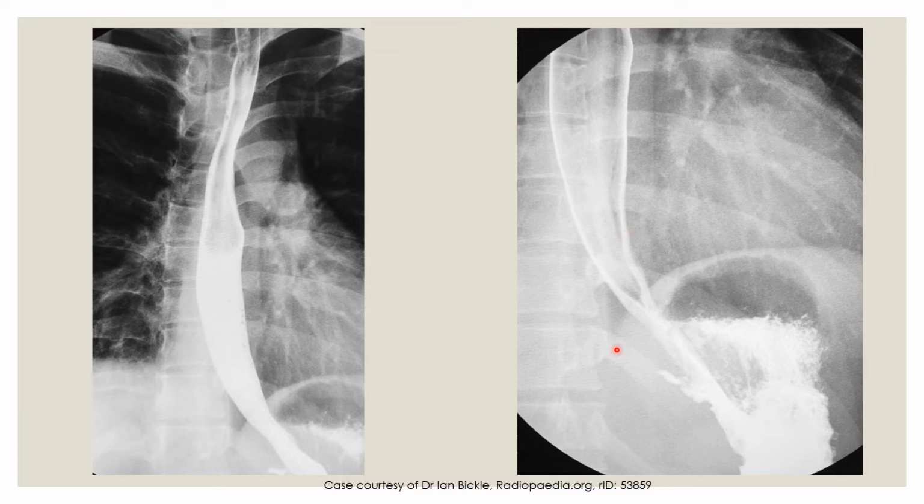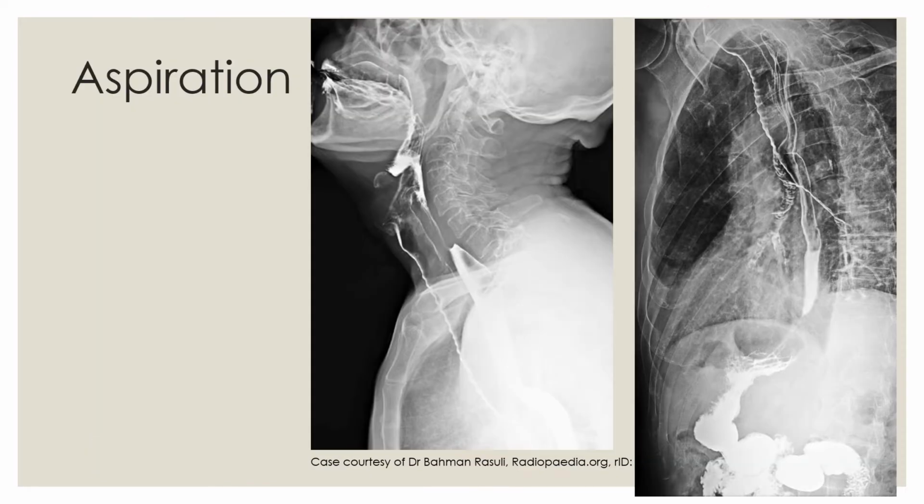And what we have here is the gastroesophageal junction and the stomach. So this patient is standing up, and stomach normally can contain gas. And so what's happened here is that the high density and actually heavy contrast material is spilling into the stomach and outlining the stomach folds. But as the patient is standing up, air will always rise in physiological circumstances, and you can see that the stomach fundus is actually being outlined by air. So I hope that wasn't too quick, and I hope that all made sense.